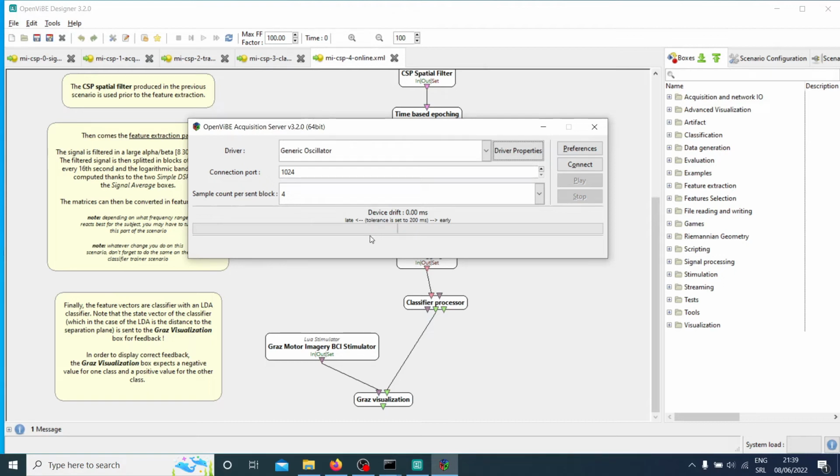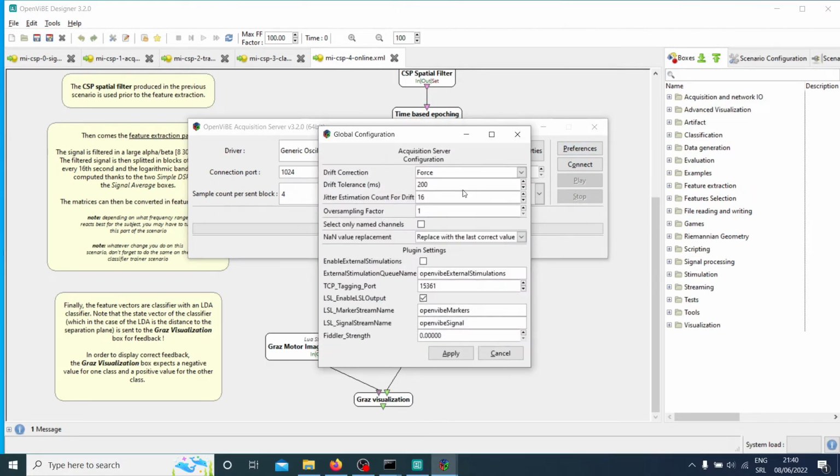If you set a 256 sampling frequency and the data is arriving a little bit later, something more than 256, then you will see how late it is. This buffer is basically filling up with late packets. What is critical here is that imagine you have motor imagery or a P300 paradigm in BCI, and it's very important that the data arrives at the right time. In this case, you would be receiving the data like 3 seconds late or something, depending on how much you put the tolerance. So it's very important that this tolerance shouldn't be too low either.